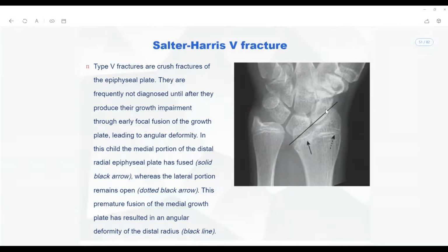Since there is a vascular compromise to this place, that's the reason. Can you tell me what is the blood vessel and what is the nerve involved here? Last time we didn't deal with the carpal tunnel, but what is the nerve that is involved here? What is the nerve that does not form the carpal tunnel?